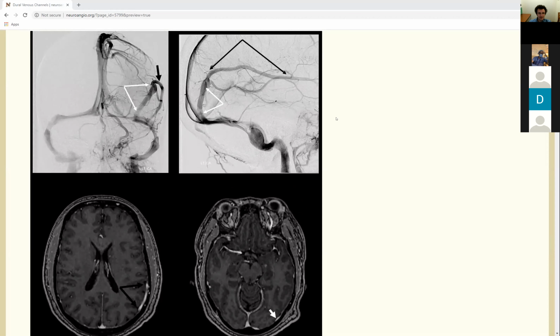So here, we're putting this together, and we have a lot of these examples. Here's a person with, it's not really a labbé, it's just some giant vein that this person has. But before it connects through this, there's a segment here that you see how it's flattened.